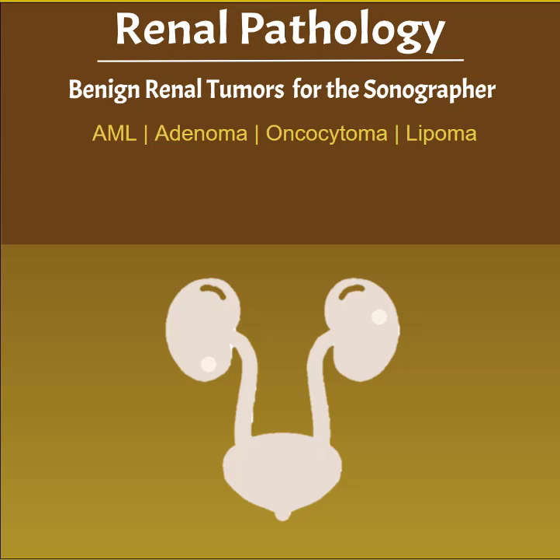Welcome to our sonography lecture on renal pathology, part 5 of 14, benign renal tumors for the sonographer. This lecture will cover angiomyolipomas, adenomas, oncocytomas, and lipomas.